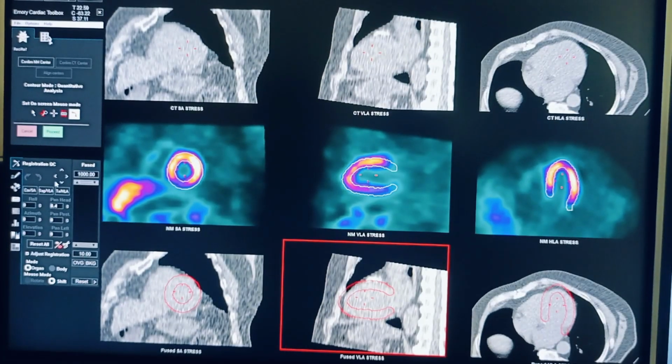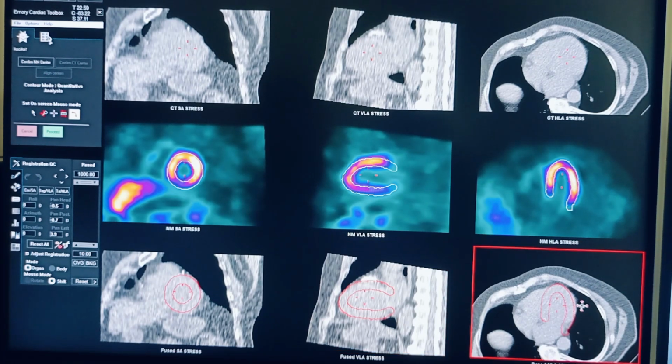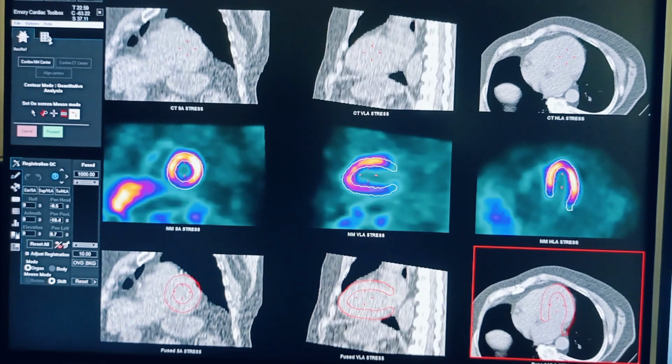These are the arrows. If I want to shift the CT image a little bit towards the left, I will click this left arrow button. Now you can see all the others getting adjusted. This one I want to shift a little bit to the right, so the image should move a little bit to the left.